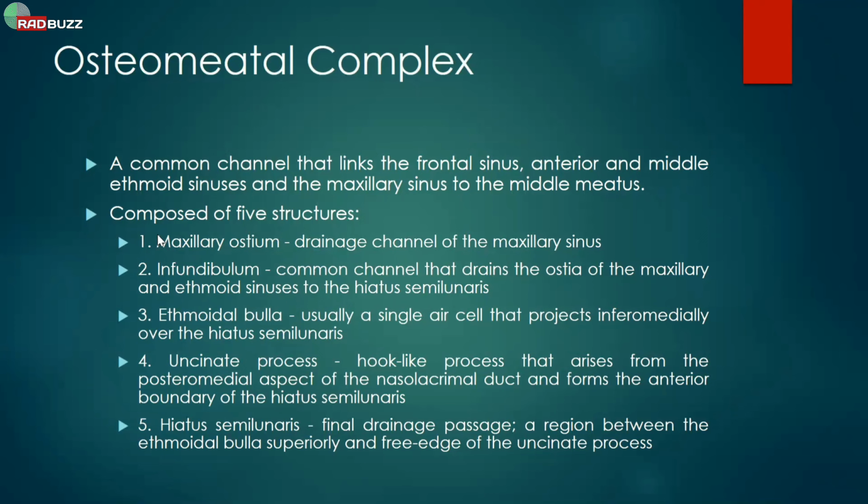It is composed of 5 structures. Maxillary antrum and maxillary ostium, sorry, that is the draining channel of the maxillary sinus. I will show you all these structures one by one. Infundibulum is a common channel which drains the maxillary sinus and ethmoids to the hiatus semilunaris, which, second time I'm telling you, is very important.